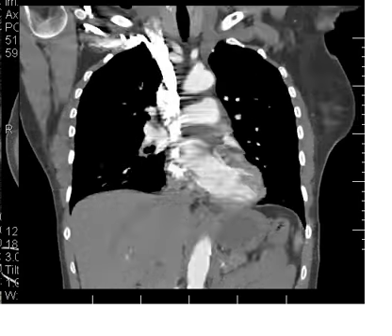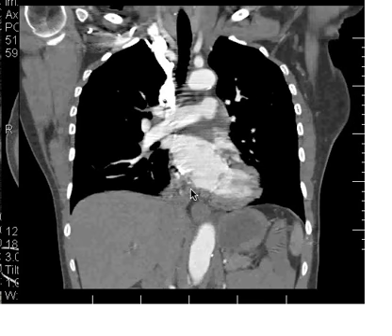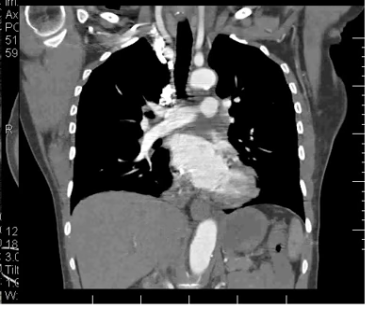And sure enough, we get back a little farther, and here you see it giving off the right main pulmonary artery. And just beyond that point, we see it more clearly, the left main pulmonary artery. The left main pulmonary artery dives back a little bit more straight than the right pulmonary artery.